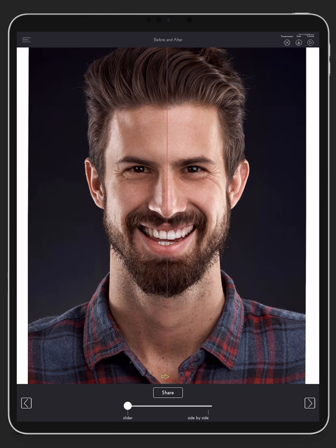We can go to the 3D smile design, and keep in mind, the patient likes triangular shapes. So we have many shapes that we can select and find out which one matches with the patient's preferences. Plus, we know the laterals need to be shorter because the patient likes a dominant smile.